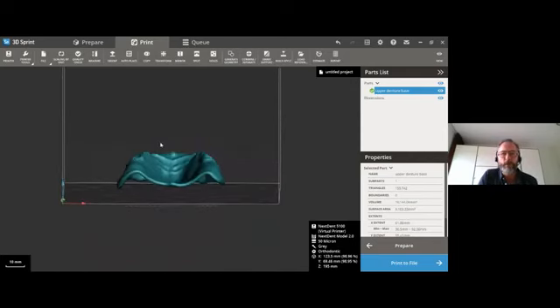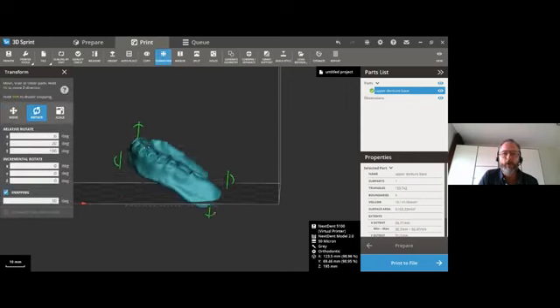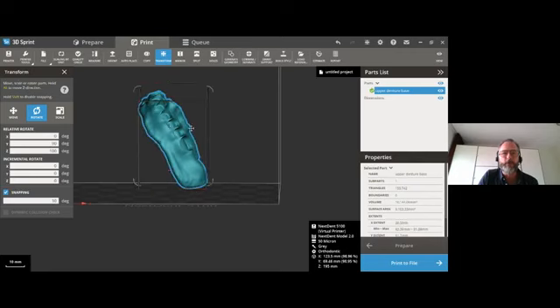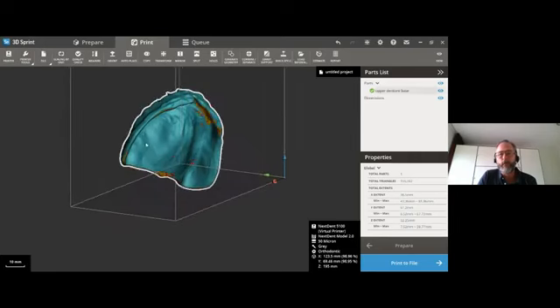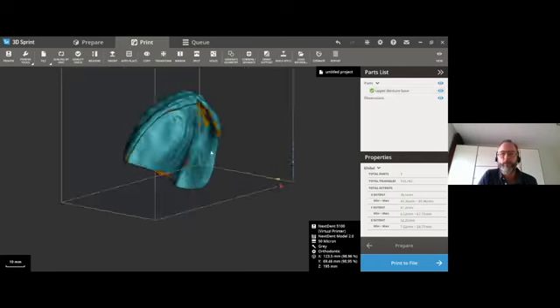So that's why we are already in an early stage looked at orientations that were more or less under an angle, let's say like this. But we have played around with different orientations, and we found that an orientation of 60 degrees gives you an overall better quality, both from a tooth fitting surface and an inner surface, so the surface that actually touches the gum.